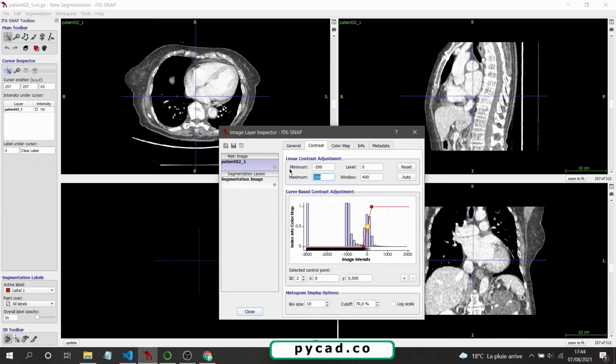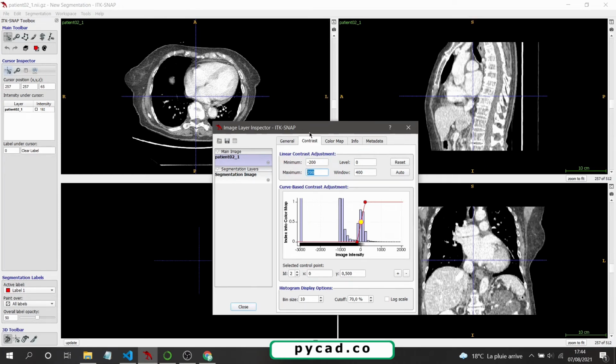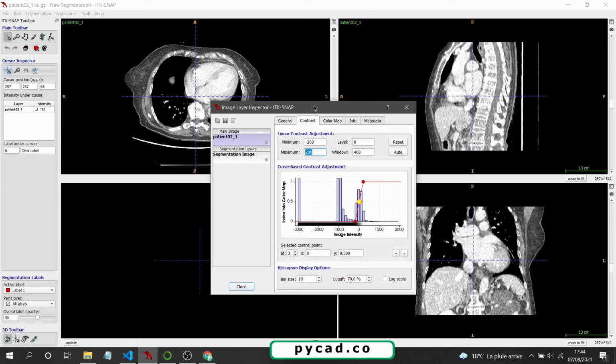Because when you want to normalize a vector or a matrix, you have the maximum value and the minimum value, and you apply an equation to convert the maximum value into 1 and the minimum value into 0, and between them the equation calculates each value depending on its value. For example, for 1000 it will be, I don't know, 0.5 or 0.6. You know about this, I will not talk about it now, but that's what I did.